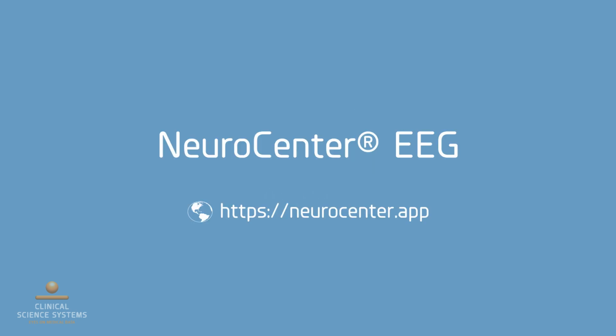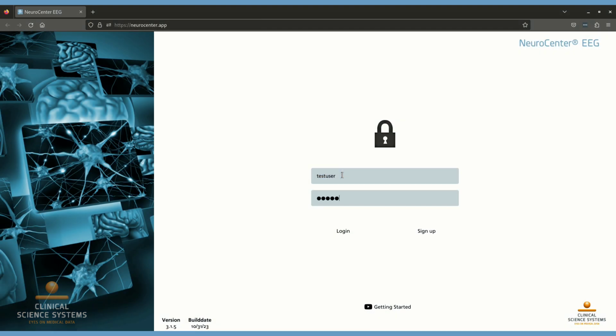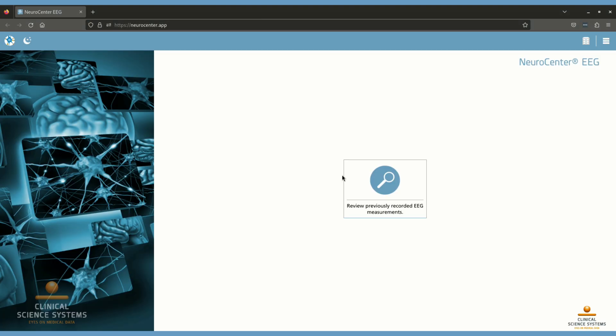This tutorial covers the basics of working with files from your online cloud storage. It is assumed that it has been set up correctly, so we proceed with uploading an EEG.